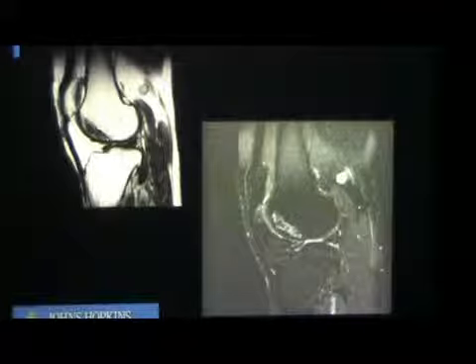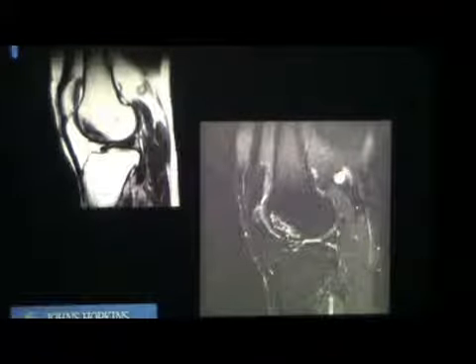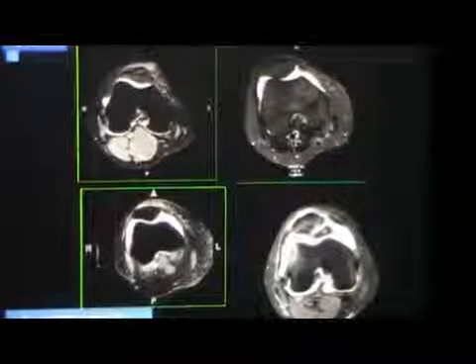And these are the classic infarcts. T1 dark, I told you this sequence you can see in the background of fat, dark lesions, so avascular necrosis, bright on T2, almost symmetrical, okay, benign. And here is a classic avascular necrosis with all these double layers, okay. Granulation tissue and creeping substitution, all you read in pathology. But this is a very classic appearance. Bone infarct, has fat within it. It has double layers, okay. Alright, so that's enough with marrow.